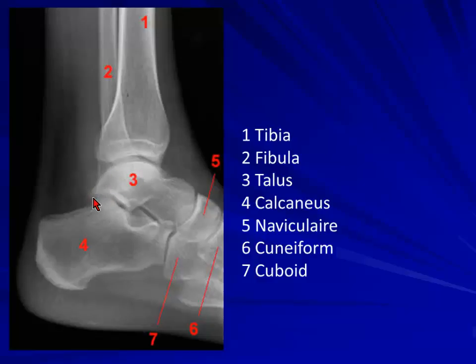This is most likely the medial tubercle of the talus, or medial projection of the talus, and there will be one on the lateral side exactly the same. That will be the lateral process of the talus. What Gopi showed you here that was hot, that was os trigonum. Os trigonum is an ossicle which fuses with time and becomes ossified, and it becomes one part of the talus. If it doesn't, then it stays as os trigonum, and it is prone to injury and inflammation.